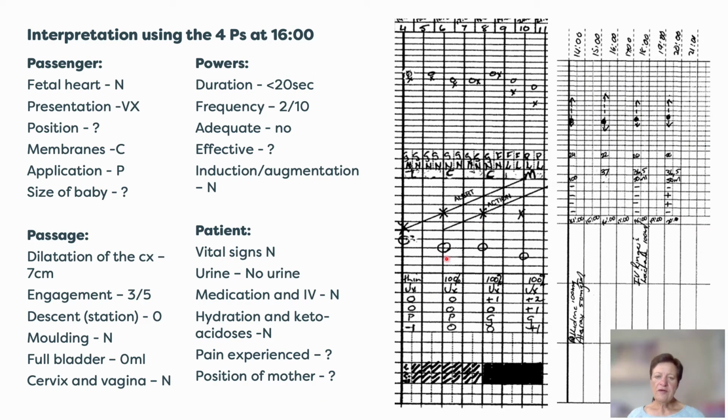Now when we look 2 hours later, here you can see these people were not very good. They haven't monitored the fetal heart half hourly. Even now, it looks as if the patient had a CTG on, because they determined the variability and that there are no decelerations.